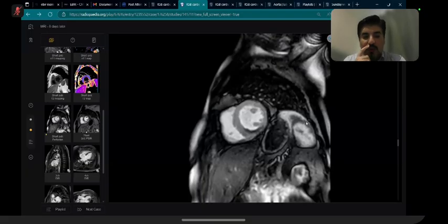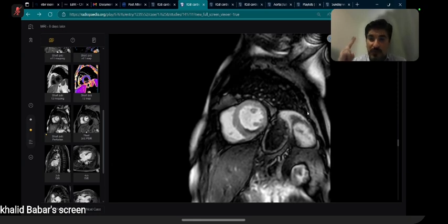If you want to look for microvascular obstruction, the best sequence is the early gadolinium sequence. You can sometimes see it on the late gadolinium sequence as well, but the best sequence for that is the early gadolinium sequence. On early gadolinium sequence, we usually look for two things. Number one is this microvascular obstruction. Number two is thrombus. Any thrombus will be non-enhancing on the early perfusion images or early gadolinium sequence. While if it is a mass or a metastatic lesion, it will show either heterogeneous or homogeneous enhancement. So these are the uses for early gadolinium enhancement.